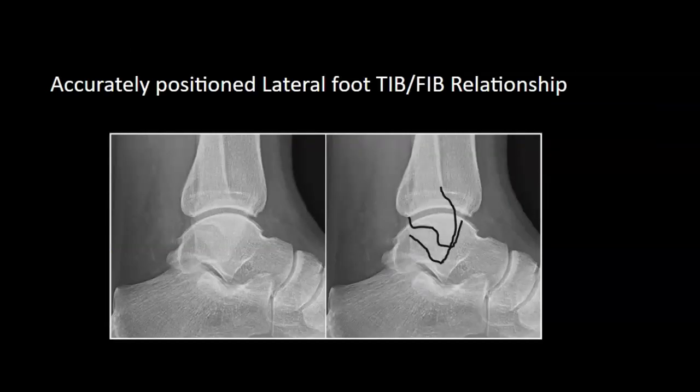In an adequately positioned lateral foot, I wanted to take a closer look at the tibio-talar joint space. We're looking for both those talar domes to be superimposed and this joint space to be free of superimposition. In addition, you want the relationship of your tibia fibula to be demonstrated as so.